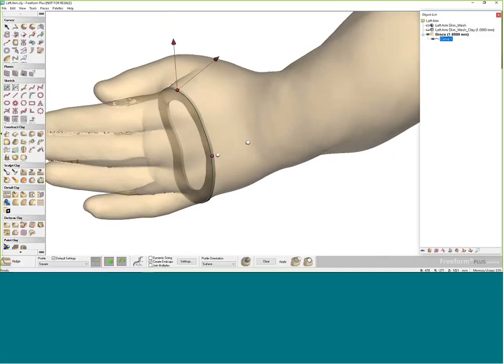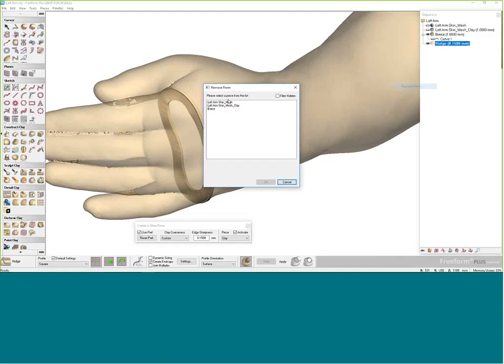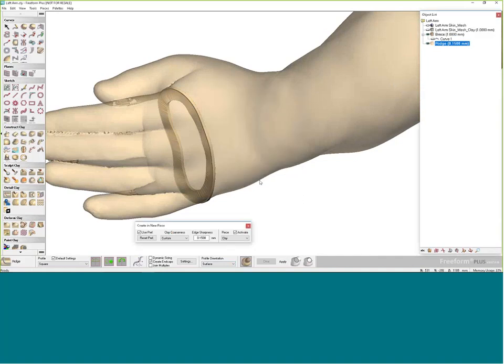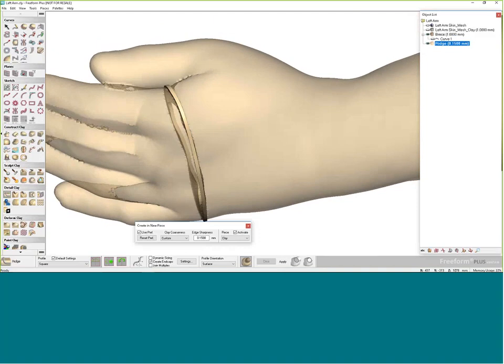And if I make that transparent, you can see that it's actually a ribbon. And what I'm going to use this ribbon for is a cutting tool. So I'm going to make it a separate piece with a high clay coarseness, so it makes it a sharp cutting tool. And I'll go ahead and add that, and it's going to display here. Okay, so I can go ahead and remove that from the brace. And you can see that I have a good cut line.